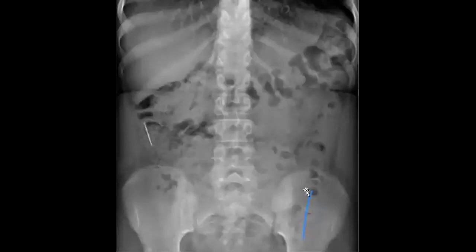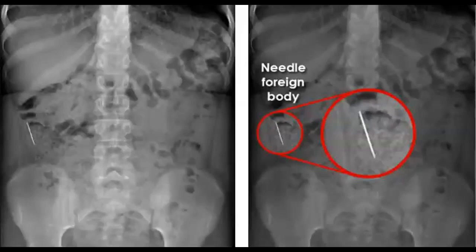So another needle, can you remove this blue line? Another, what is the annotation? Yeah, here to remove. Is it removed or clear? Yeah, clear all. Okay. So needle foreign body, again ingested. This patient has mild abdominal pain. So needle foreign body. Exactly.